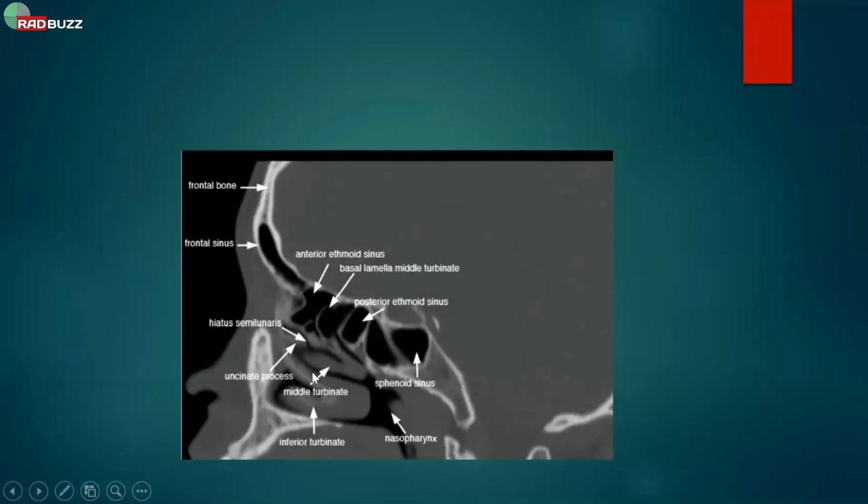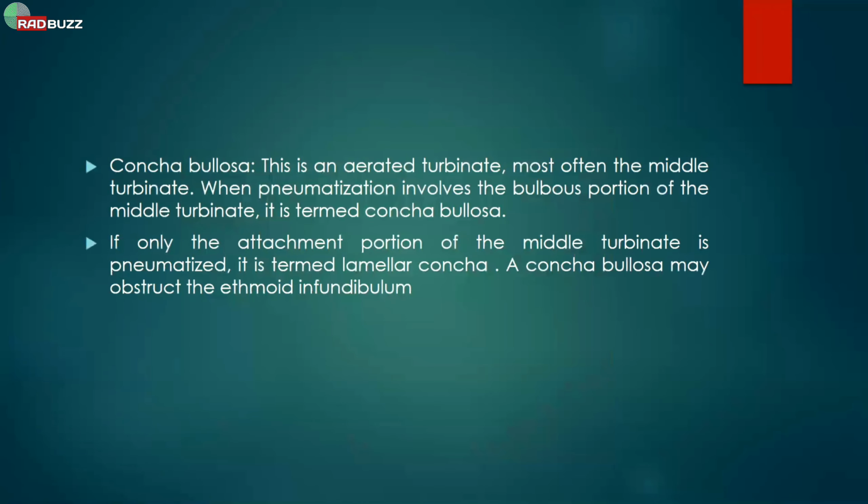If there is anything which is disrupting downwards, there will be accumulation of the secretions above into the frontal and ethmoid sinuses, obviously. Now the trick is to differentiate between the retained secretions and true pathology. That will give us an idea what is going on. When we discuss the pathologies, we will see MR is the better modality than CT to look for these pathologies at times. CT will help, but basically to differentiate the soft tissue things, MR is better.